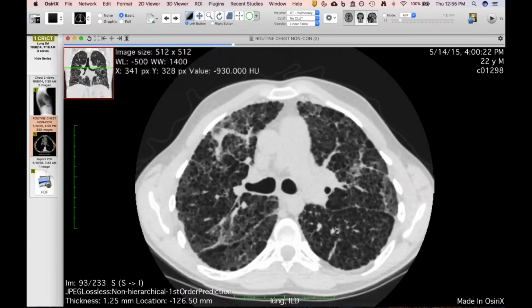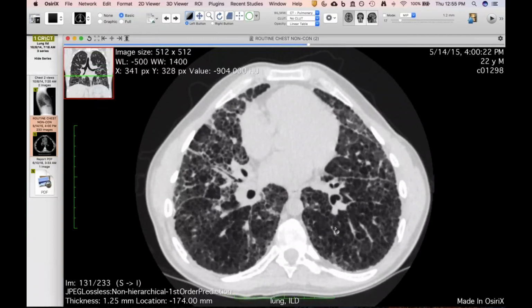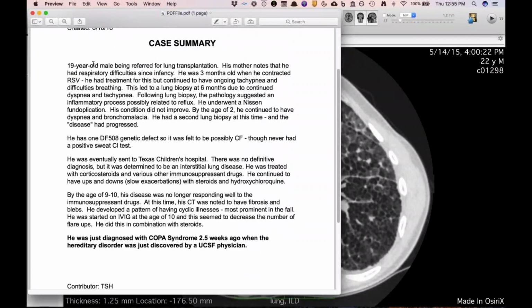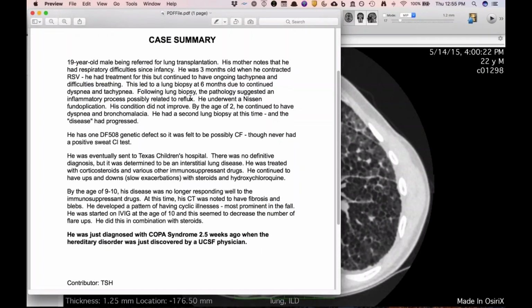Travis, this one looks like it has a lot more of the cystic stuff in it. Was this a smoker? No, 22-year-old. Yeah, it looks like at that time 19. Yeah. Emphysema, just like in the case I showed, where the patient never smoked. Right. So this is Chris Meyer.